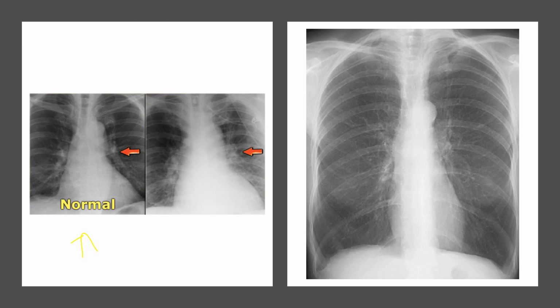Let's use purple. So here's a normal cardiothoracic size for an adult. And then when we're looking over here, you see how much more dense this is. You still see your moguls, but you see how much more dense this cardiothoracic structure is, right?